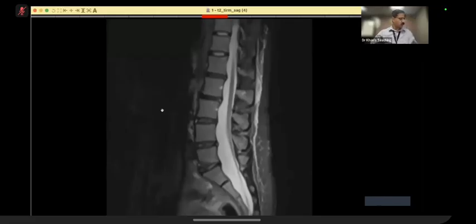2, this is a 32-year-old female, leg weakness, bladder dysfunction. Unfortunately, the patient was slightly claustrophobic and we could acquire only 3 sagittal sequences, but I believe you will be able to make your diagnosis on the sagittal. Over to you.